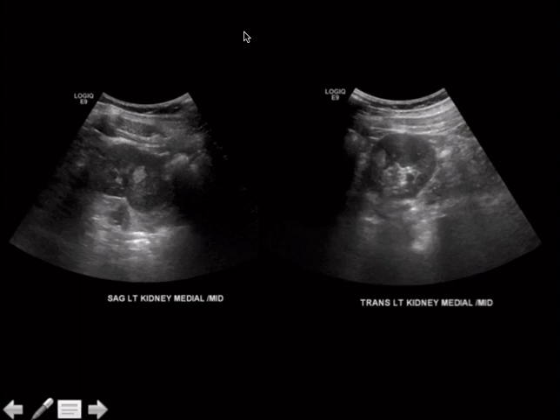I don't believe in coincidences. I don't think they exist in the world of multiple choice. So if you've deliberately chosen the right kidney, I feel like you've chosen it because you want me to see the difference between the right kidney and the liver. If you've shown me the left kidney, you're not worried about that, and it's more likely to be a focal lesion.